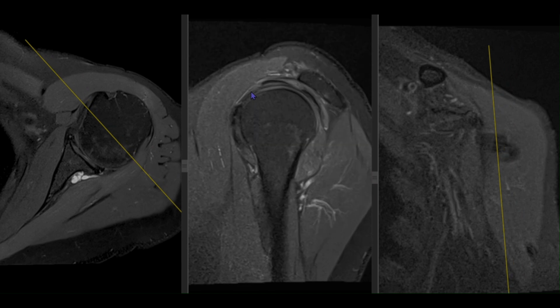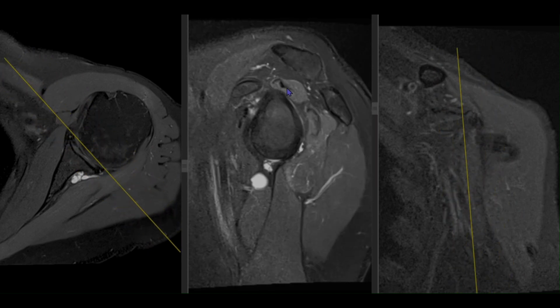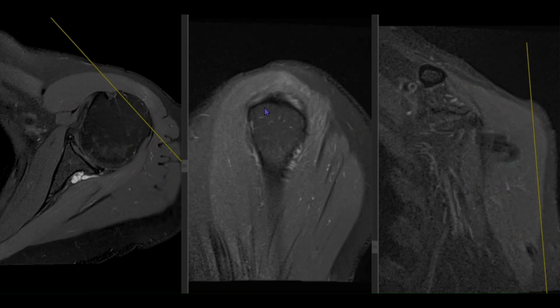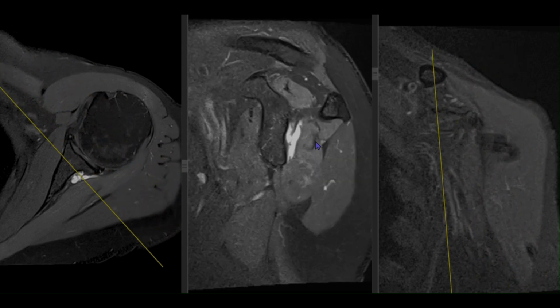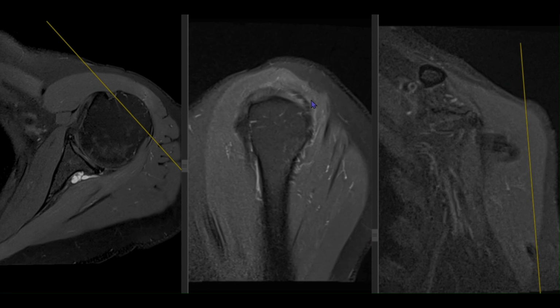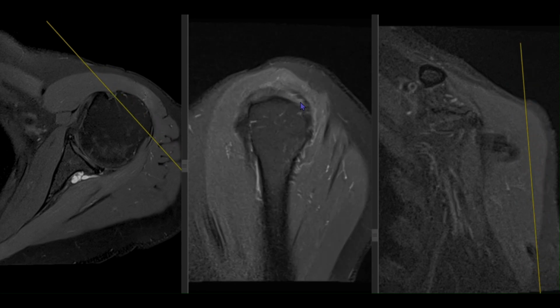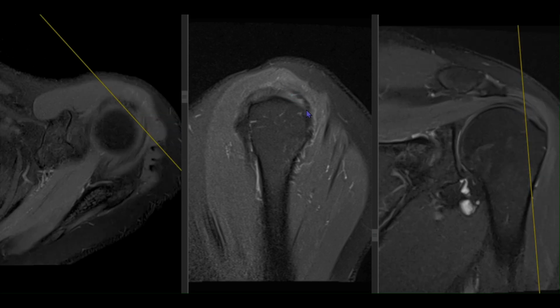Now going on to the supraspinatus. So in the supraspinous fossa, we'll trace from the myotendinous junction all the way up to its insertion onto the greater tuberosity. No tendinosis or tear is evident. The same thing will do for the infraspinatus. Again, from the myotendinous junction, we'll be tracing it up to the level of insertion onto the greater tuberosity posterior aspect. Some kind of hyperintense signals on the PDFS images noted within the conjoint fibers.